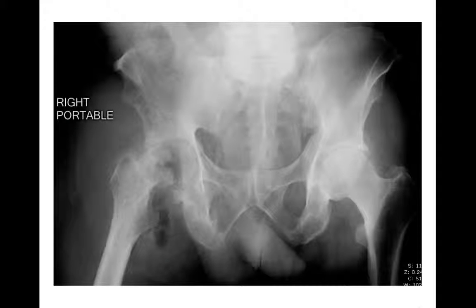All right, next case, a radiograph of the pelvis. In this case, we have a destructive lesion which has destroyed the proximal femoral head. There are these small lytic lucencies through the proximal femur and the iliac wing. So this is a permeative lesion. It's destructive, destroyed part of the proximal femur. So something aggressive here in this case. We're not going to think of any benign things in this case. If you're sharp-eyed, you'll notice these lucencies right here, which are gas overlying the soft tissues. That may lead you to think that this was an infection.